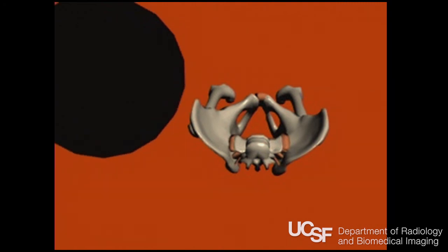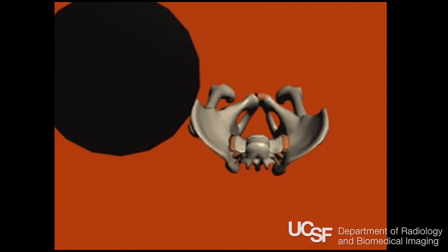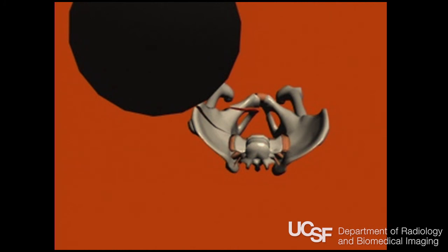This is one of the mechanisms for a very severe lateral compression injury. This gives you what's called the windswept pelvis. You get run over, you get a lateral compression on one side, then the tire drops into the pelvis and opens up the opposite side. So you get a lateral compression on one side, and then you get an anterior compression or a shearing injury on the other side, opening it up. And so it looks like the two wings of the pelvis have moved over as if the wind had blown them. That's why it's called the windswept pelvis.